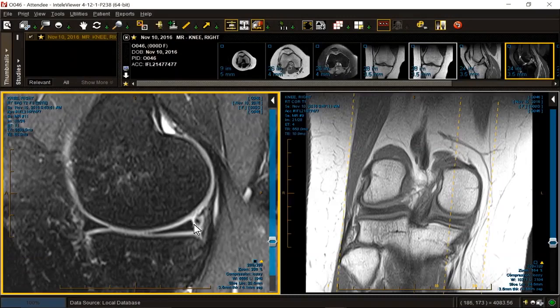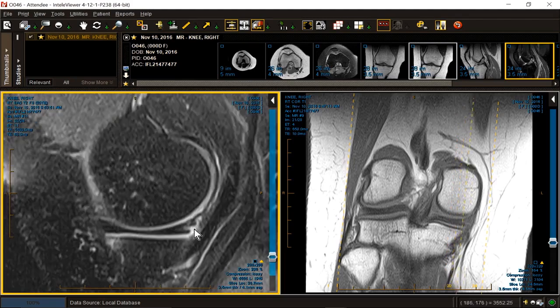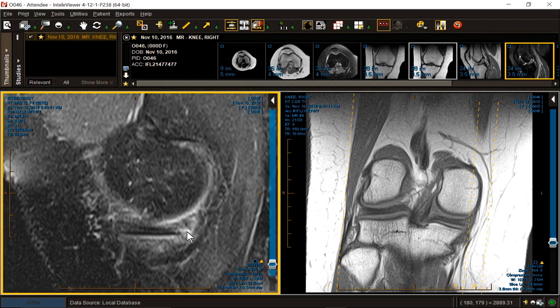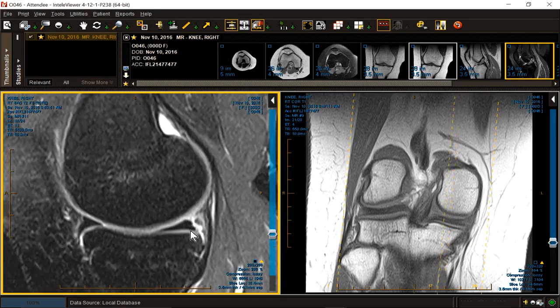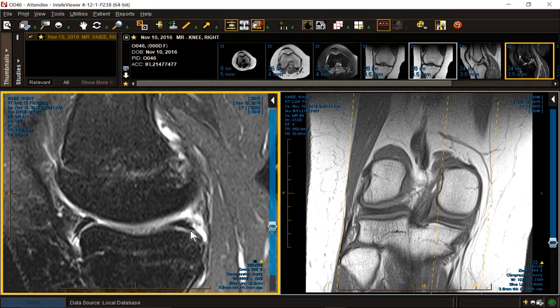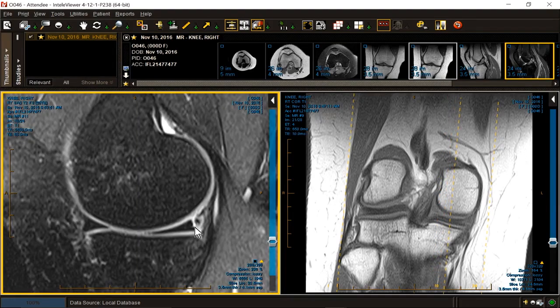Or if it's inside in the meniscus vertically, we would call it either a full thickness, or in this case, partial thickness, vertical tear, and then we count slices. So it's here. It's at the posterior medial corner. So one slice, we'll call it 4 millimeters. 4, 8, 12, 16, 20. Also say it's about 2 centimeters, 2 to 2.5 centimeter vertical tear with slight complexity in the outer red healing zone of the posterior medial meniscus of the knee with meniscocapsular sprain.